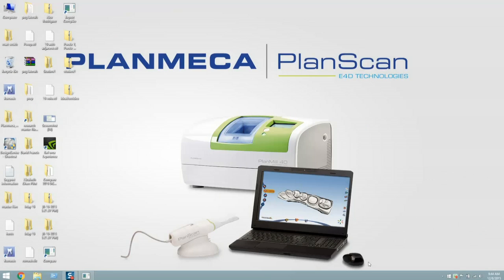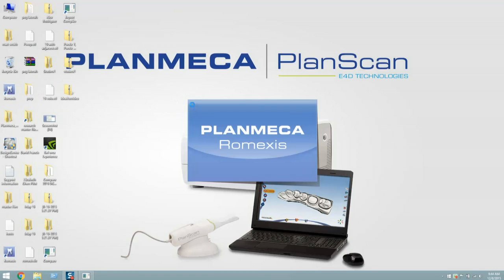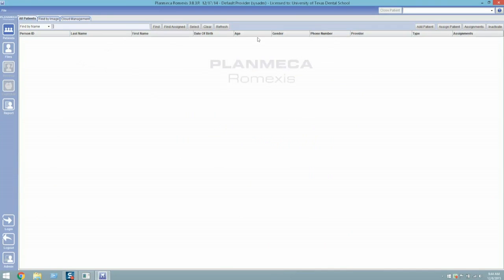Okay, this is a tutorial video on how to use the Romexis scanning software and compare analysis software for Class 1 preparations. We start off by opening the Romexis software. This allows us to scan in our preparation.